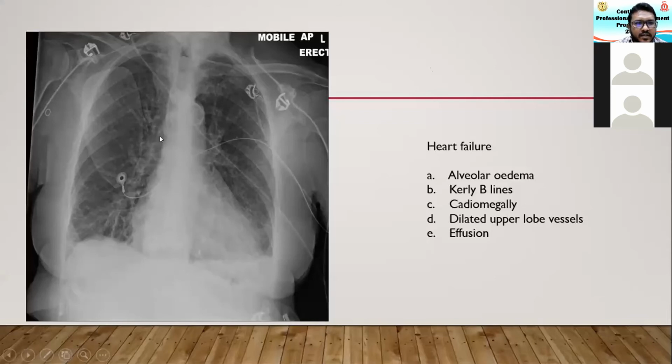And if you look at what's happening in the chest X-ray, you will see that there are a little bit more added opacities, and there are a few tiny lines going up to the chest wall. Usually in the pulmonary fields you have three segments: medial, intermediate, and lateral.